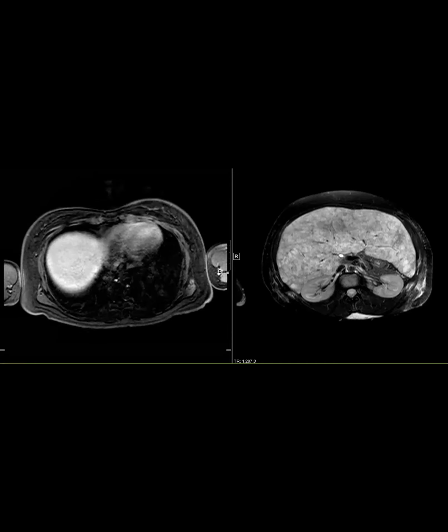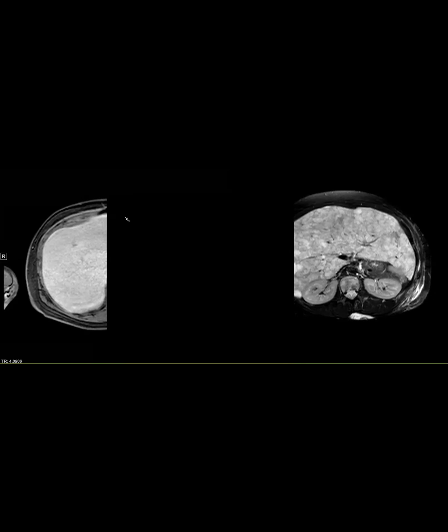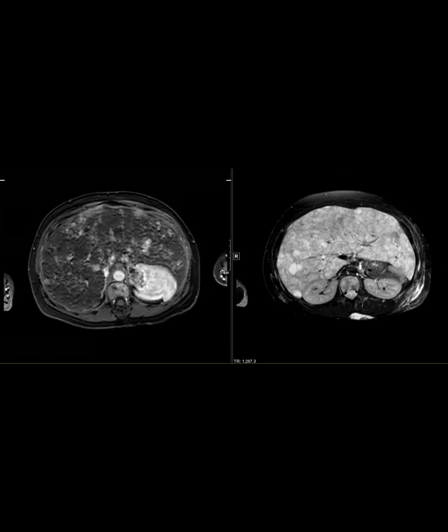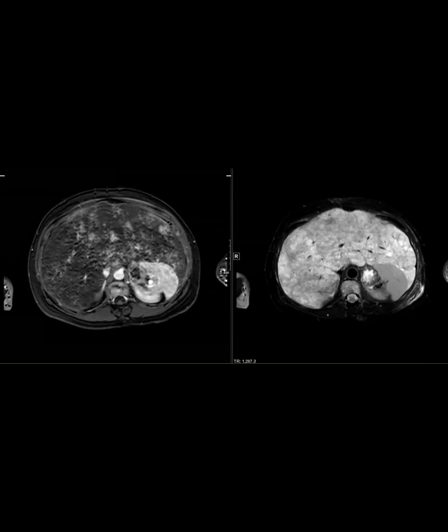But can you show the T2 again? And Gitanjali, can you tell us what made you think HHT? Yeah, I hope you can all hear me well. My mic is not that great. So I said it based off the arterial phase, when you get these ill-defined areas of arterial phase enhancement. Our IR section does a lot of these cases, so we get to image livers in those cases and it shows similar findings. Yeah, this is a very typical appearance of small capillary telangiectasia in the liver. But if I had seen the delayed phases or the T2 fat sat first, I wouldn't have guessed that. It was just based on the arterial phase, and it has the appearance of those small capillary telangiectasia scattered throughout the liver.